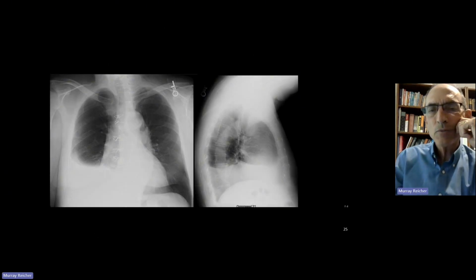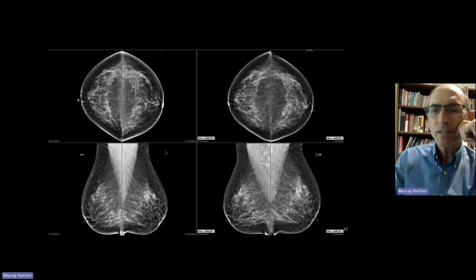Chest X-rays, we've been looking at chest X-rays side by side, again, since Röntgen. Wouldn't we be better off looking at them this way? Even if they're not perfectly registered, the changes and the findings are easier to detect and faster.